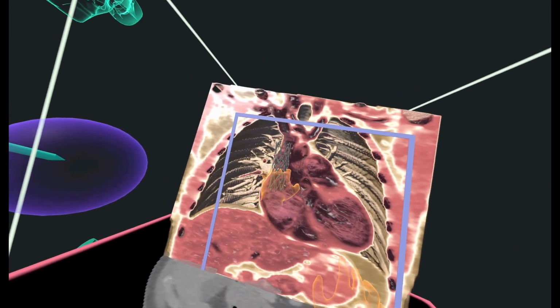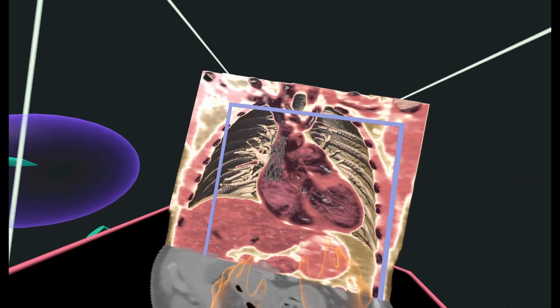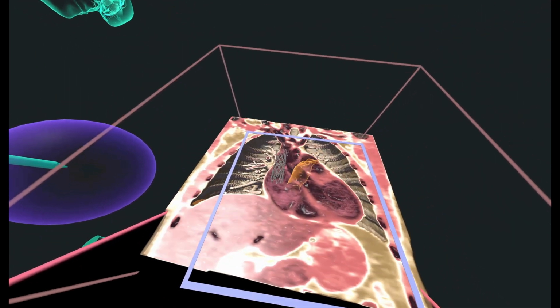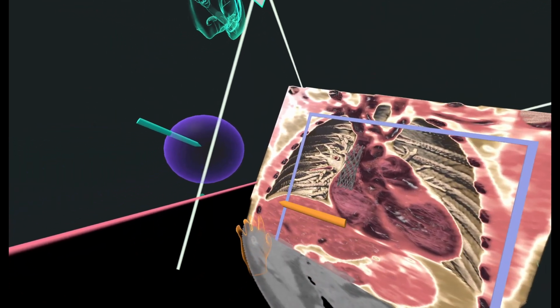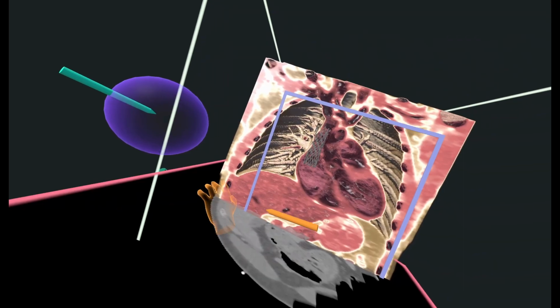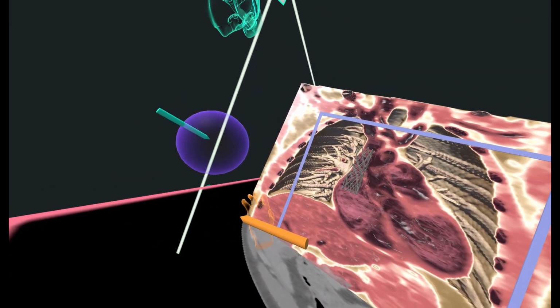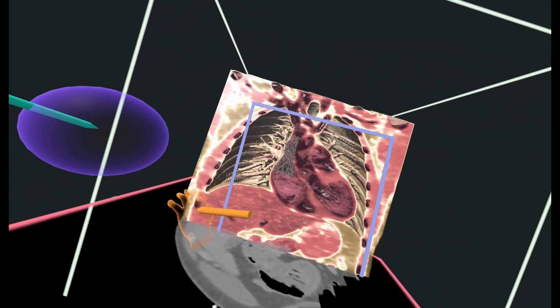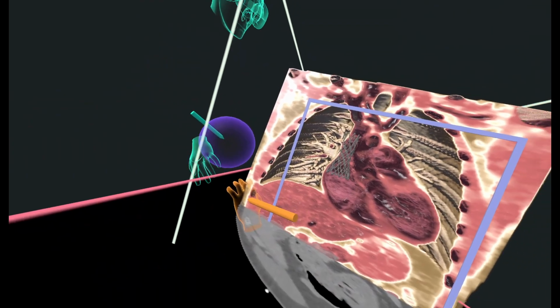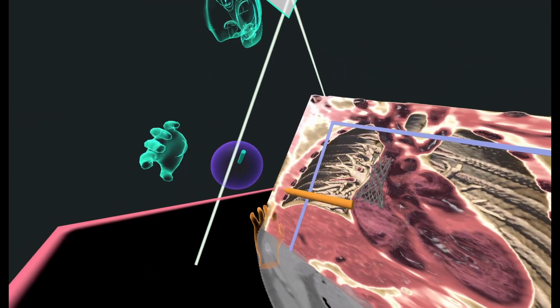And then we need to make sure that we're covering the SVC, the actual defect. So I'm going to bring it down a little bit, but then we don't have contact yet. We have to make that flare, so we can anticipate for that as well. We can flare at the end and flare from the start end length, so we can change that here very easily. We can see the flare that opposes into the walls, and that to me looks really good.